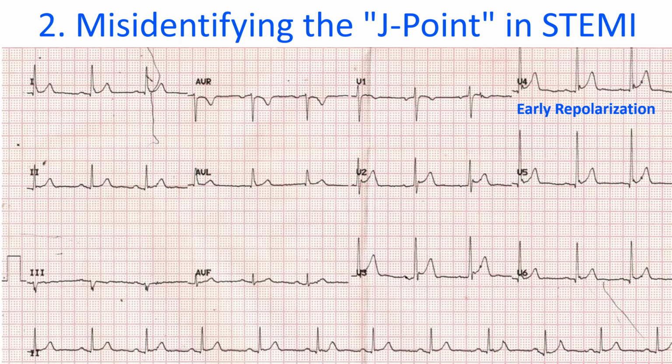Use the TP segment, the baseline between T wave and the next P wave, as your reference point for 0 and not the PR segment.